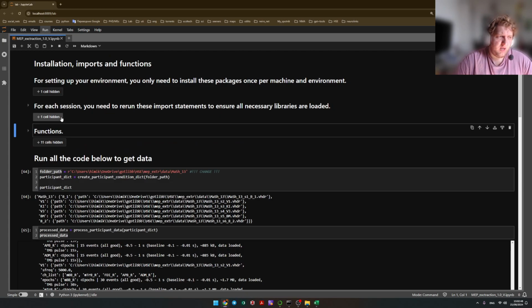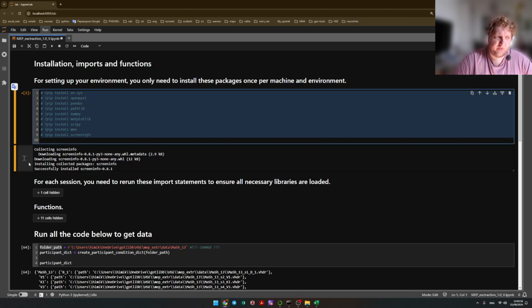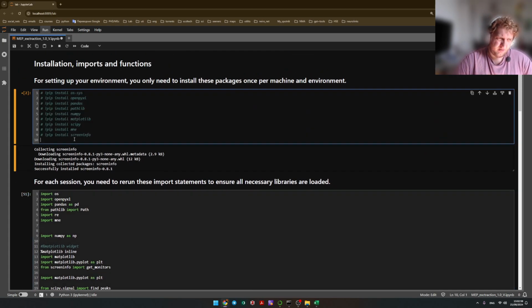If you have a problem with this one, or with the imports, for example, some error occurs, or something bad happened there, write to me. I will help you with the environments. This is tough stuff. Yeah, so I think that's all.